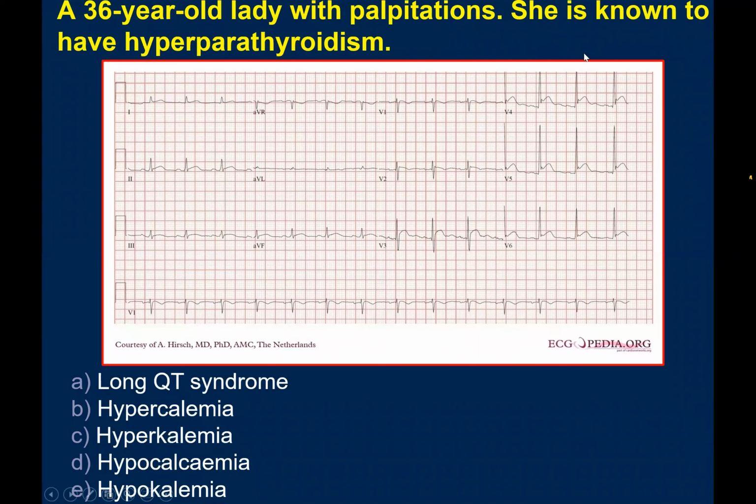Does it look like the same as the ischemic ECG I showed you before? Or does it look like typical ischemia, these changes? The curve of the ST is not the one we see in ischemia usually. And you see there is a notch there, yeah? You see that small notch? There is a notch here in the J point. So actually this is called early repolarization.